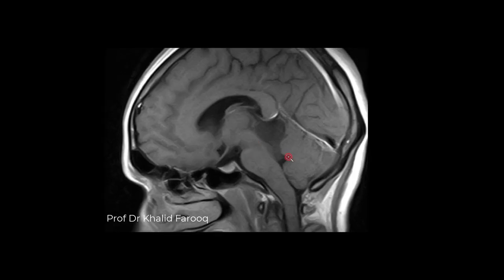So we prefer the rare possibilities of aqueductal cyst having differential with neuroepithelial cyst or ependymal cyst of upper portion of fourth ventricle, while differential would be with pineal body cyst or pineal gland cyst.